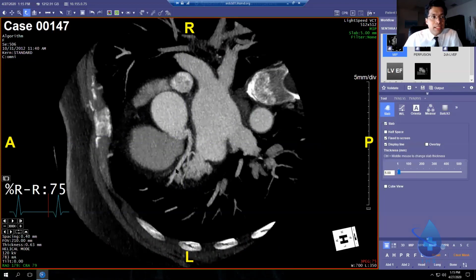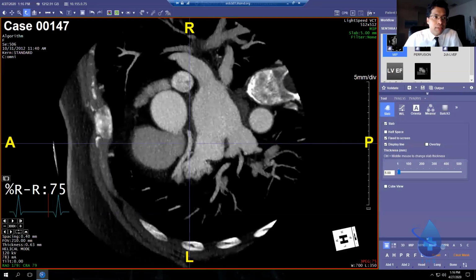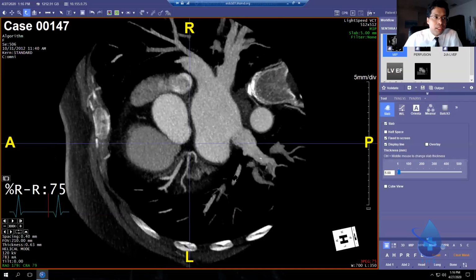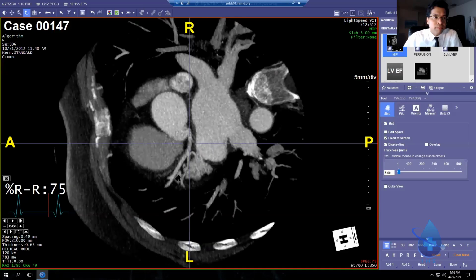So this left main, we can see it coming down the interventricular groove. It's giving off a ramus. Here's the appendage superimposed on it, just superior to it. If you cut below that appendage, you'll see that there's a circumflex as well. This is the great cardiac vein. This is the triangle of Brocq-Mouchet right here.